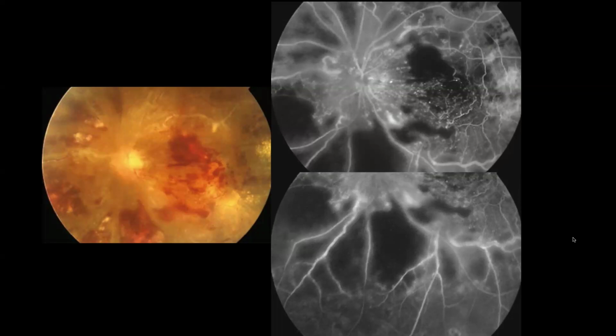So this is the fundus photo of the left eye. Slightly hazy media with multiple areas with indistinct borders. There are areas of multiple hemorrhages involving the macula and also the far periphery, with areas of whitish fuzzy lesions along the periphery.